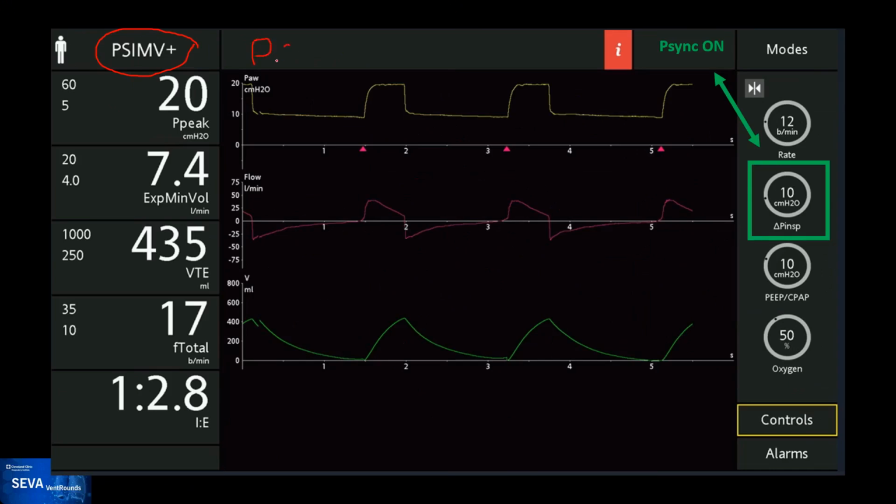Yes. So people can argue that in this mode, we cannot differentiate IMV type 1 from IMV type 2 at this time. But as Rob mentioned, when the respiratory rate is increased, the set rate is 12, you can see that the observed respiratory rate is 17. That means that at this time, all the breaths we observe are spontaneous ones.